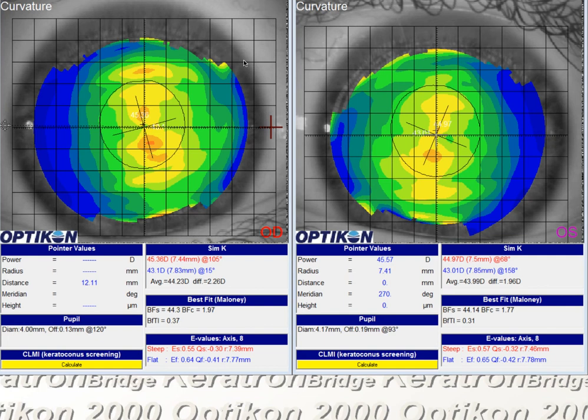This is an orthokeratology case where the patient has a fair amount of corneal toricity, about 2.25 diopters in the right eye and 2 diopters in the left. And the question was how to go about designing a lens for a patient like this, for how to decide on what type of lens to design. And so I'll just kind of go over my thought process.